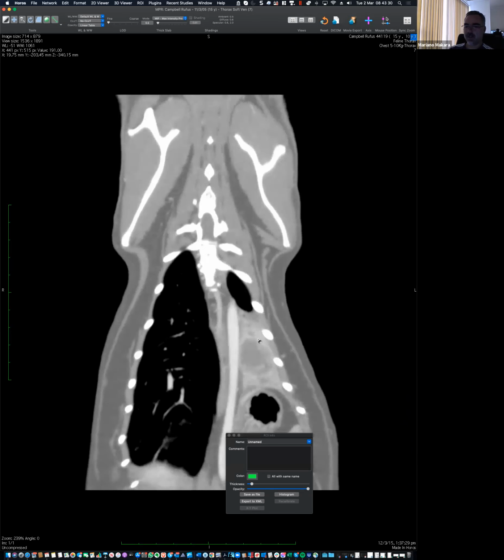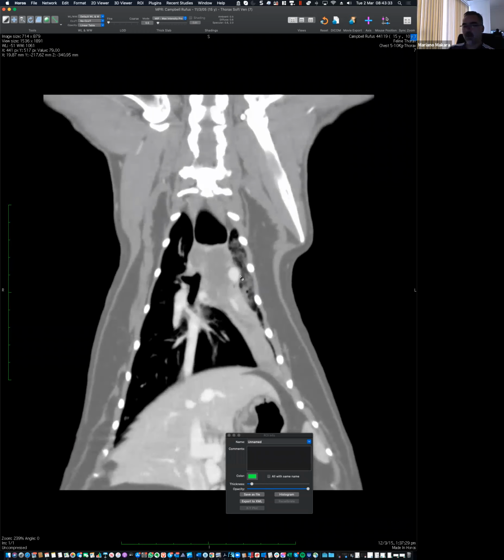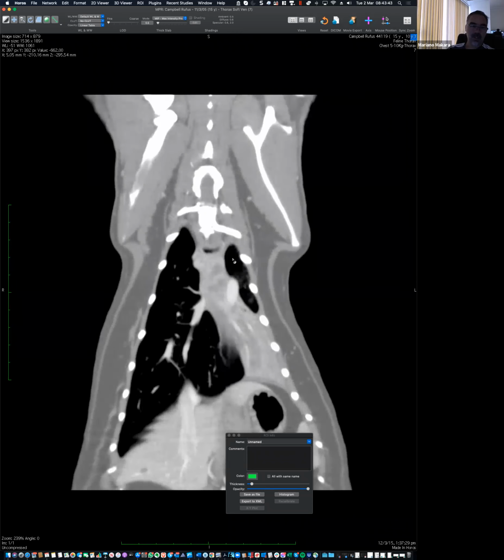Is that thinking all right? Is this helping you to kind of visualize what is happening? It's just a neoplasia that is growing through the airway. And then all the consequences of that neoplasia going through the airway, part of it bleeding, part of it obstruction. And what we are missing is our usual expectation in terms of pulmonary masses, which is our ability to see the mass surrounded by aerated lung. We usually don't get to see that. In some cases, we see it in cuts. I'm not saying that every case is going to work like this, but in some cases, it just shows up like this.